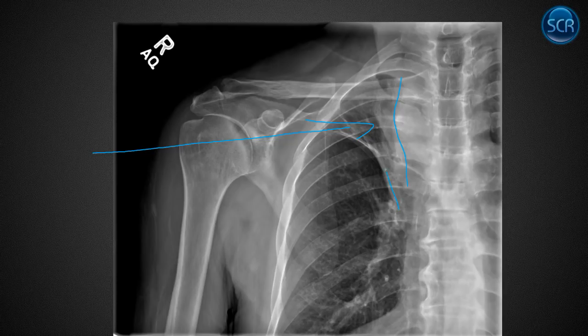So they've got this lung lesion, some atelectasis, and so this is probably a Pancoast tumor or something like that. And it just happened, the radiation happened to cause AVN in their humeral head. And that's one of the causes. There's a long differential. You can look up your PLASTIC RAGS differential. That's the mnemonic. This person, this is mostly just degenerative. This is looking a little DISH-y here, but it doesn't quite meet the criteria.